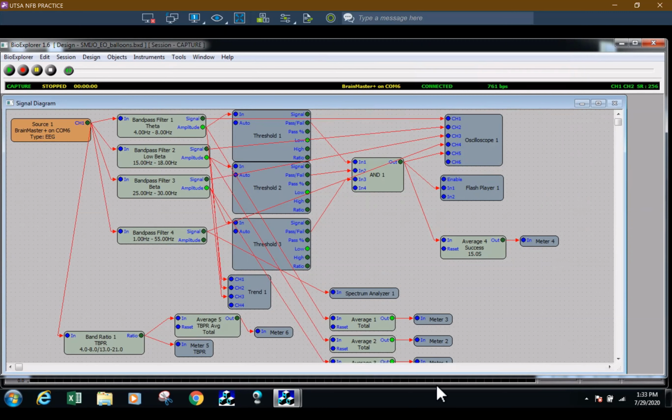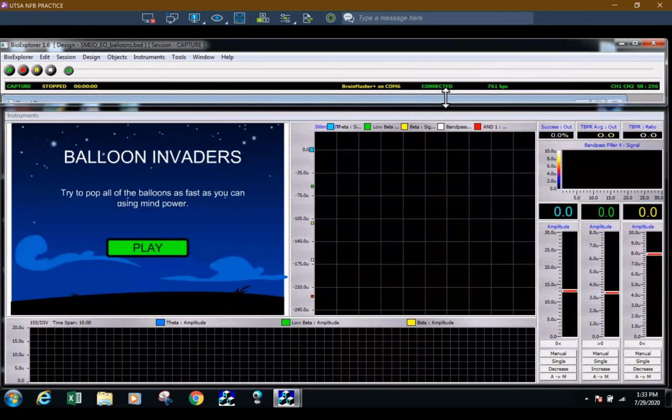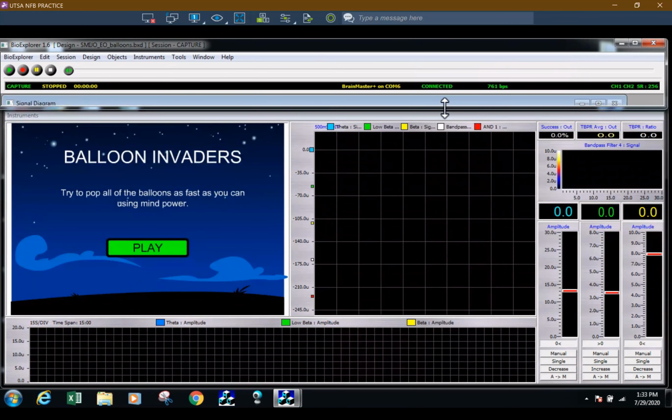So let's go ahead and record a session. So you want to make sure that every time before you start a session that you have it set up to be recorded and saved, because then if we don't, we don't have access to replay the session and show Dr. Jones for case consultation. So that's the reason why we're recording these sessions.